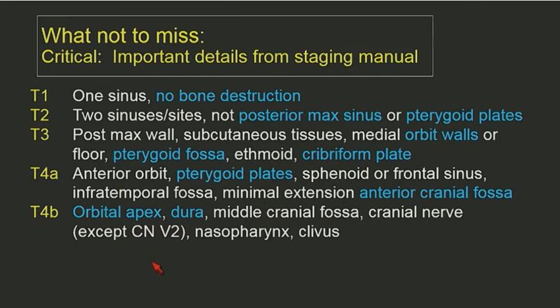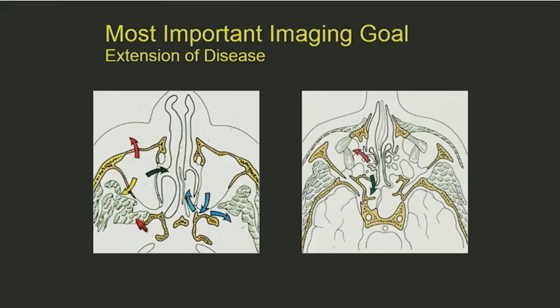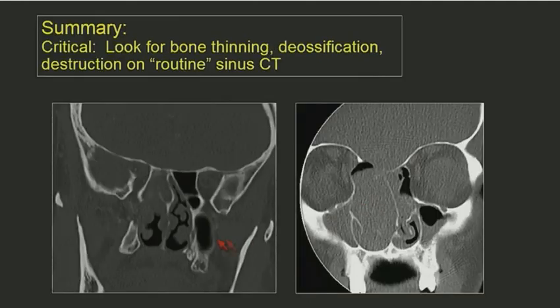with orbital apex being very serious tumor. Our job, in my mind, is to look for those malignant findings and to look for the extent of tumor, whether the cheek, retroantral fat, or up into the orbit or the sphenoid sinus.